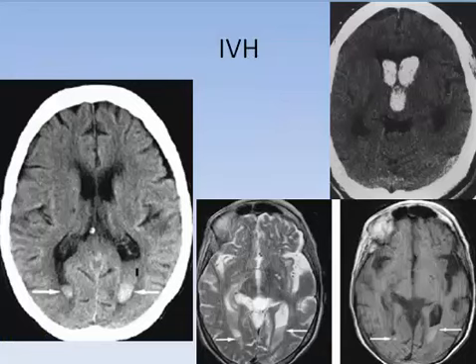Intraventricular hemorrhage filling as sediment in both occipital horns, and on the right side there is another case with bleeding into the frontal horns and third ventricle, with dilatation, of course, of the corresponding lateral ventricles, as seen by the dilated temporal horns. In the last two images, we have sediment of blood within the ventricles, as seen by MRI.